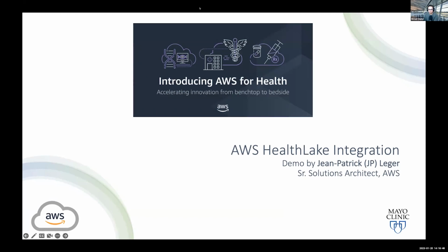Yeah, so one just came in. And again, if you have any questions, please put them in either Zoom chat or in Discord, either works. This one says, how did you simulate the PACS with an Orthanc DICOM web server? Yes, I use the term PACS sometimes very loosely, but what I meant is, yes, you are right, absolutely, a DICOM web server, Orthanc, that you're receiving.